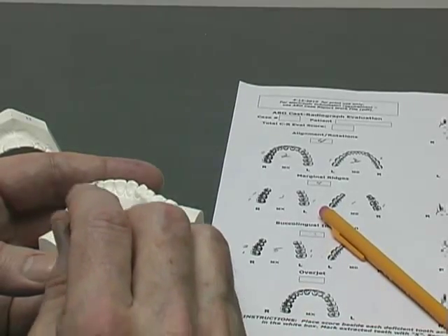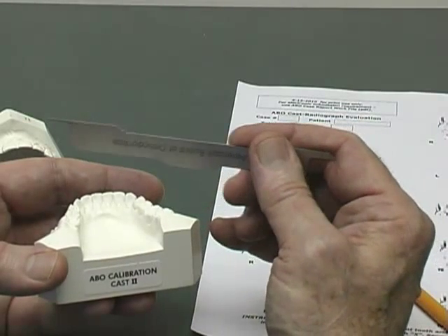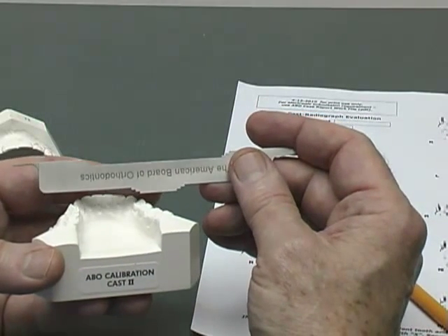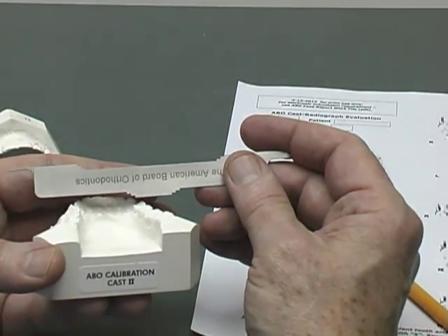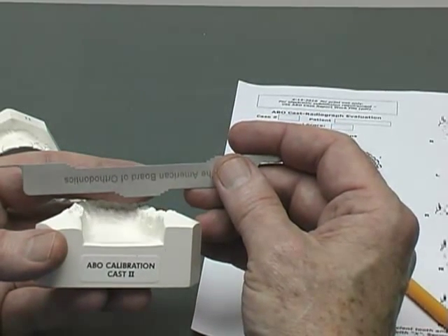So this is my interpretation, not a part of the directions, other than the spirit of the measurements always requires good judgment of the examiner for the casts and for any morphological exigencies that may exist.